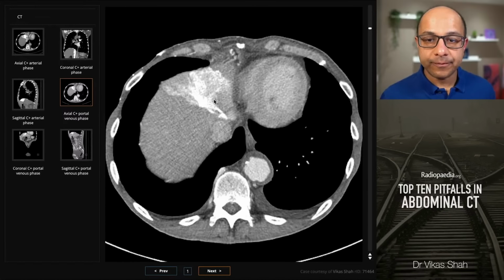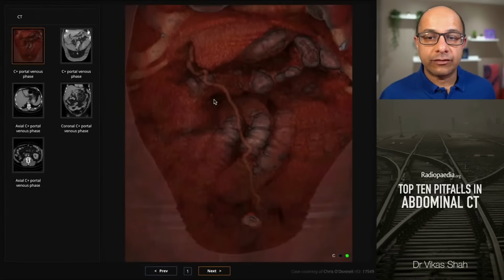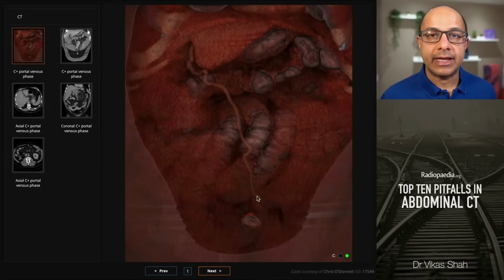And this anatomy is also responsible for the distension of abdominal wall vessels that you see in portal hypertension. So in those cases, the flow is reversed. The flow is from the portal vein into the paraumbilical veins in the abdominal wall down towards the umbilicus, as you see here.